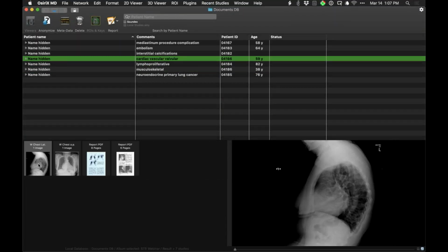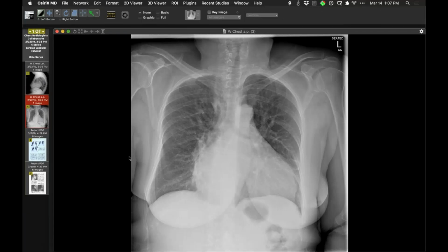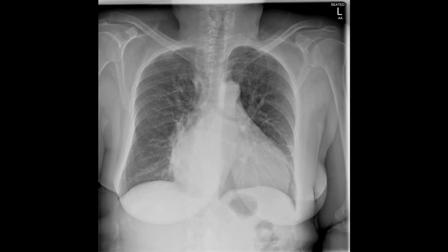This one is also back to basics, because the other week, I'm trying to remember exactly in what context we talked about pulmonary venous hypertension. So I'll show this case. This is a very nice demonstration of inversion of pulmonary blood flow, cephalization. I usually describe it as inversion of pulmonary blood flow, where in addition to perceiving that the caliber of these vessels is relatively large and these are relatively small, one can actually see two vessel rows parallel to each other.